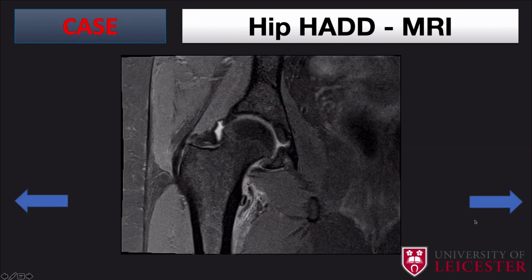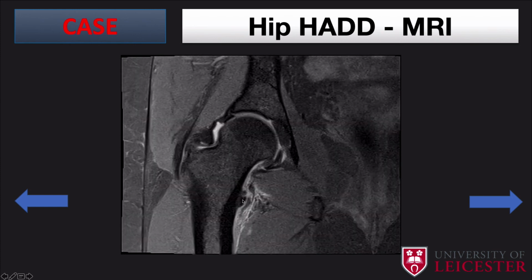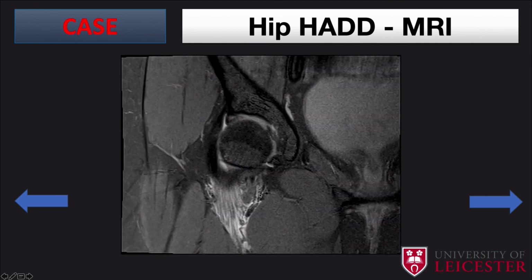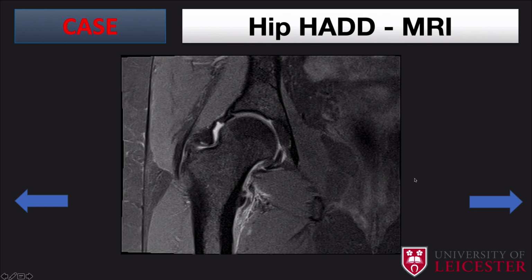Same patient, just a different projection, but you can clearly appreciate these tiny foci of low signal, which is in keeping with the amorphous deposition and the extent of inflammation that you as a result have, which is all this high signal edema within not only the muscles but also some of the soft tissue fat planes, and they are quite near some of the vasculature as well.